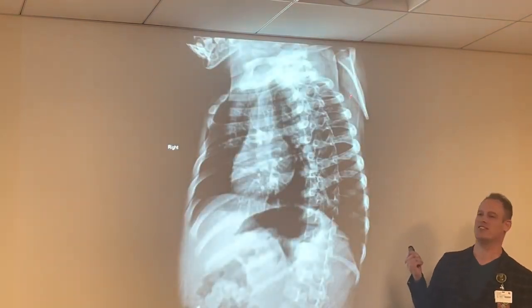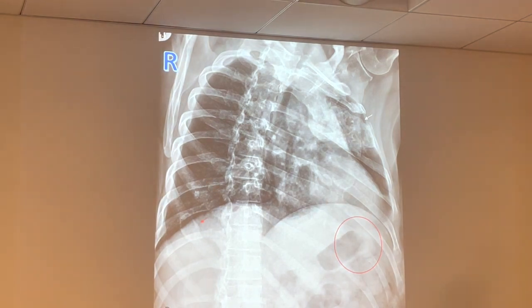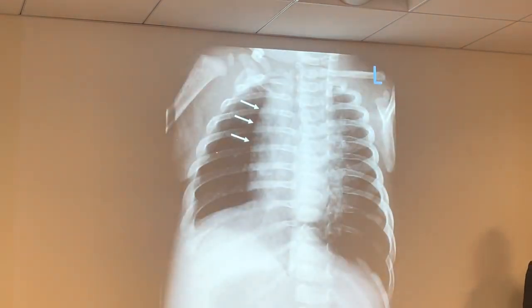Nice wide shot too. Y'all see that? What about this one? RAO. Left lung is elongated. Left arm up. And this? RPO. Why? Same side elongated, same side marked. And this one? LAO. Left side marked, right side elongated. Right arm up. Correct. We got it? Yes.